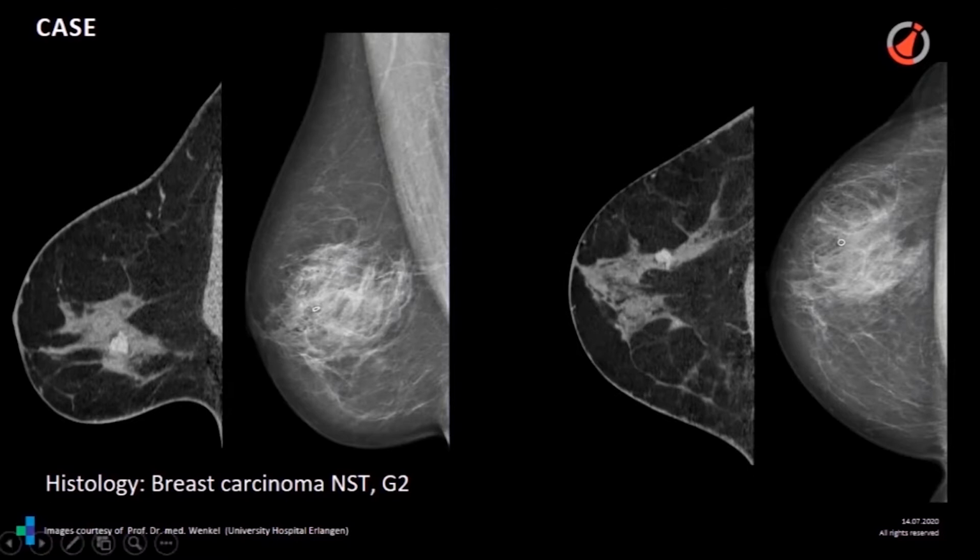In this case, in comparison with a normal plain mammography, there you see a marker in the position of the tumor, but in correlation, you see the MAMA-CT reconstructed slice in an MLO or OBL manner. And using contrast media, you clearly see the delineation of the tumor, the malignant tumor in this case.